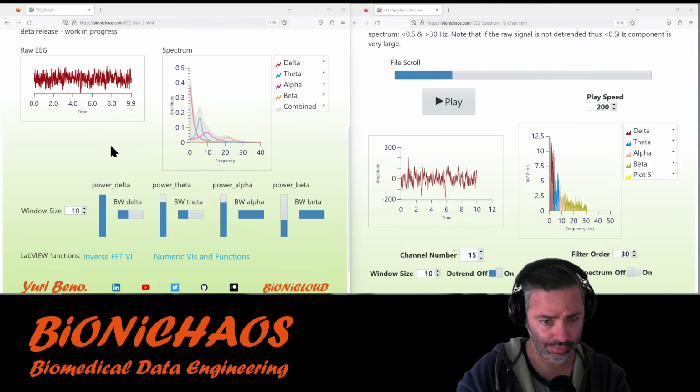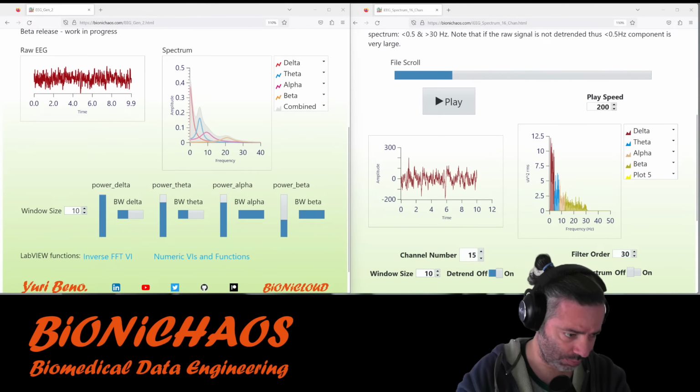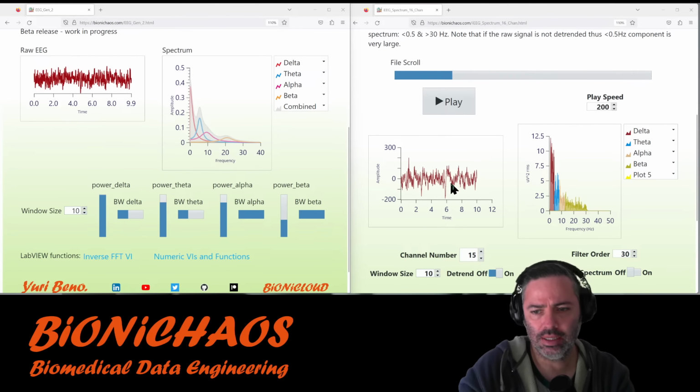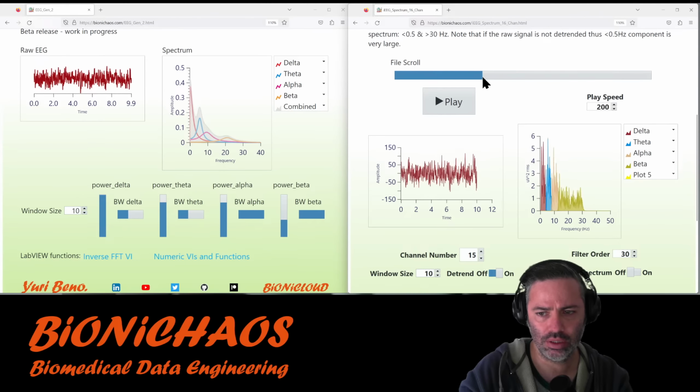So nothing fancy. Whereas in real EEG, you also have this potential spiking activity, like this one and that one, which kind of looks like a spike. But yeah, this spike is just some frequency component, nothing special there.